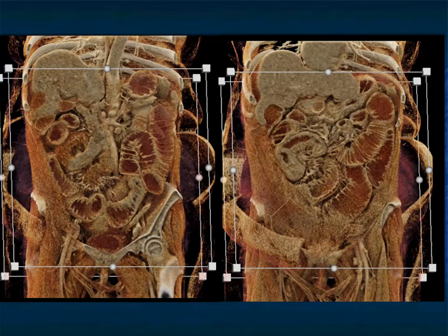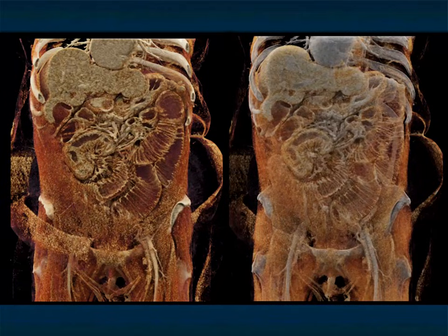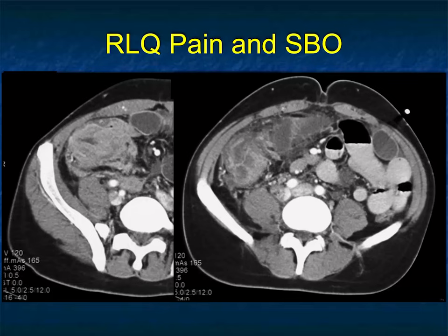And you can see some of the thickening of bowel, and you'd begin to worry that this bowel is becoming ischemic. As I mentioned, bowel looks worse with carcinoid tumors than it actually is because a lot of the patients are simply followed and the bowel pattern never changes. Patients will typically be getting chemotherapy and not getting surgery, debulking procedures.